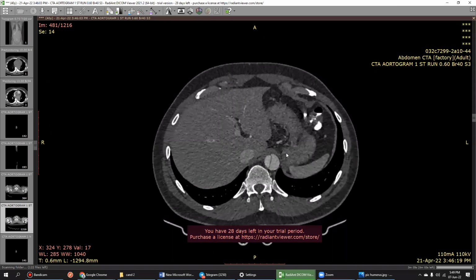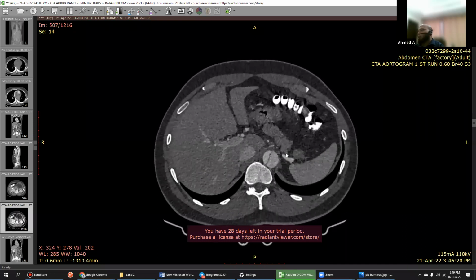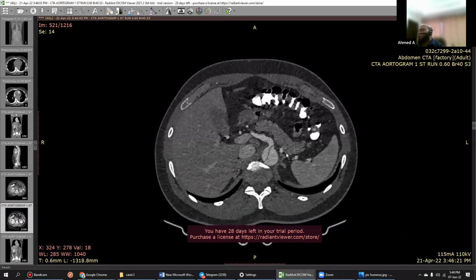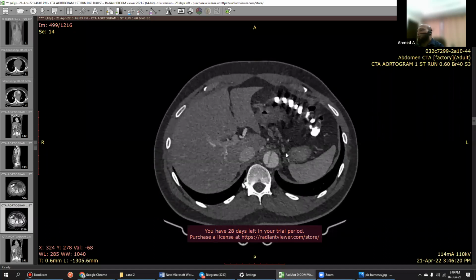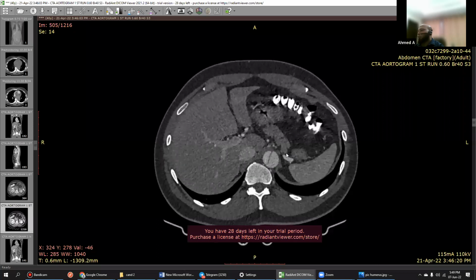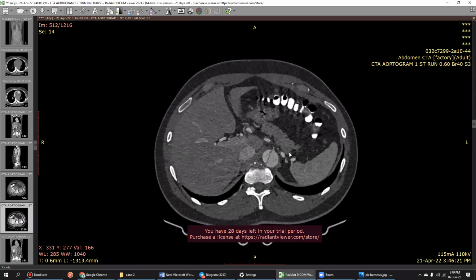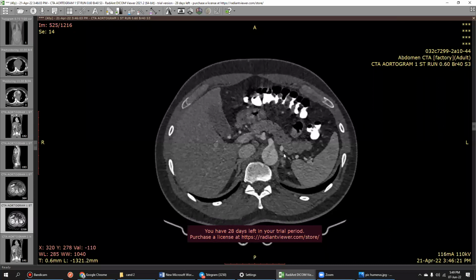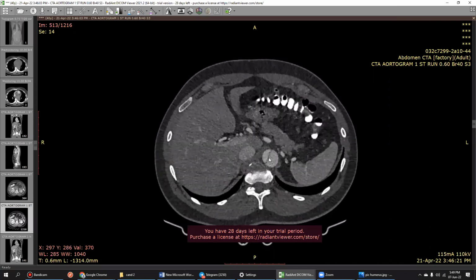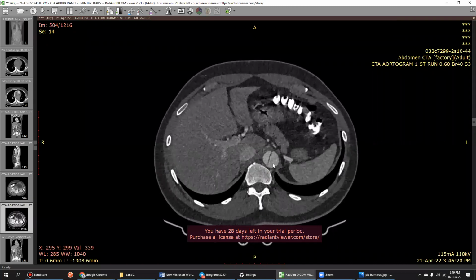In aortic dissection, when you have seen it, you score more marks by telling all the negative and positive points. You have to tell whether it's the true lumen or the false lumen, even though you know it. Which is the true, which is the false? I would like to assess the origin of the vessels. I'm suspecting the true is on the medial side, but I will confirm it.